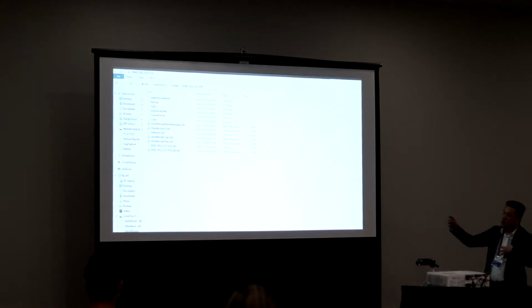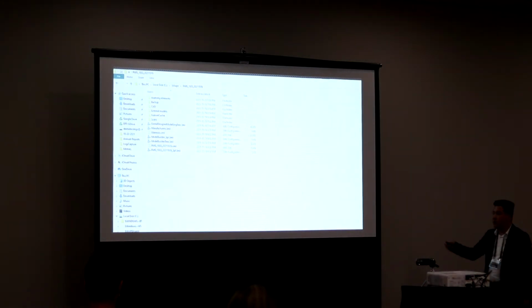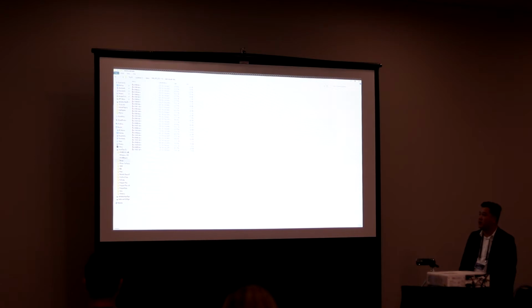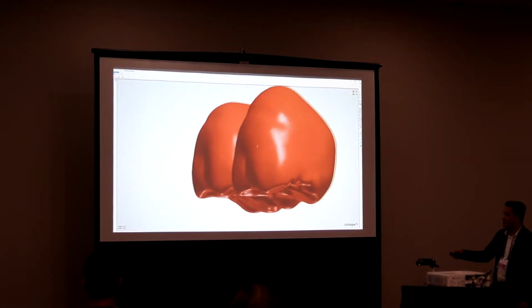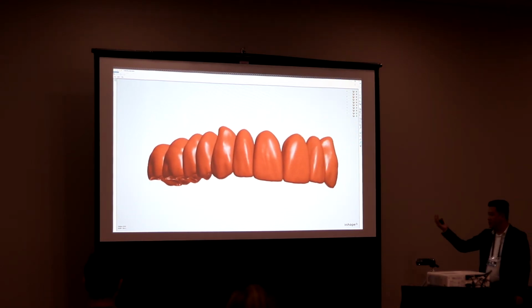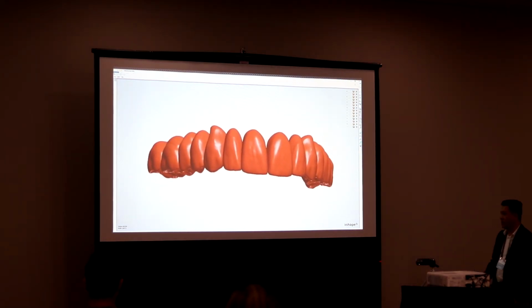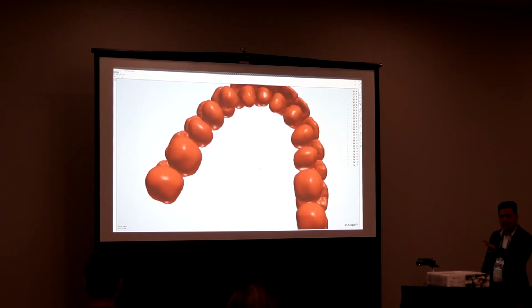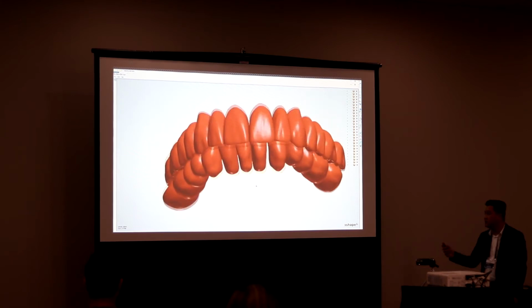So when you finish your diagnostic model, you want to look inside this Windows folder here. And you do that by right-clicking Explorer, and it'll bring you to this folder here. And the first folder that you're going to see here is this anatomy elements folder. So what this contains is a whole bunch of Pontics of the original design that you made in your diagnostic, lined up in coordination with the original pre-prep scan. And they're all there, they're all in alignment. Keep this in mind, this is a very important folder, especially for these copy and paste type of workflows.